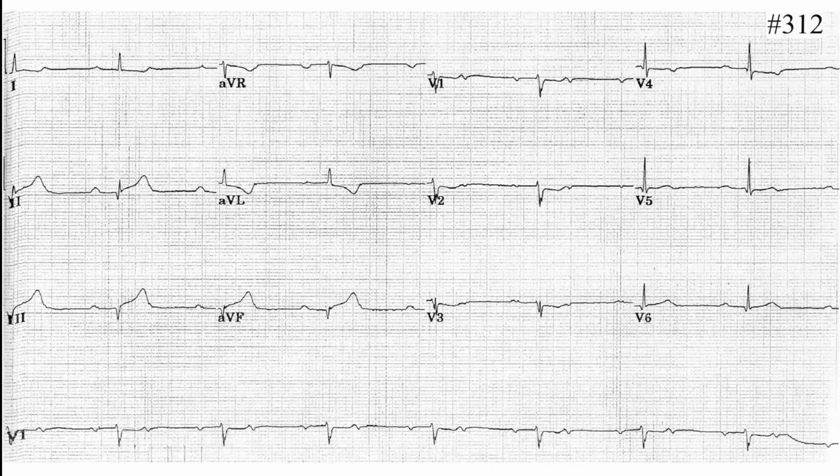So then the ST segment. No, pathological Q wave first. If there's a pathological Q in 3 and AVF, 2, 3 then AVF, it's inferior, and then ST elevation as well. So it's acute. It's an acute inferior MI.